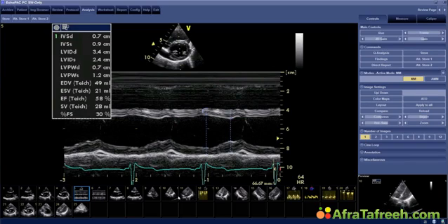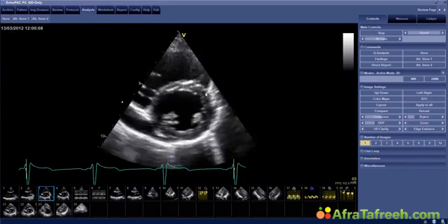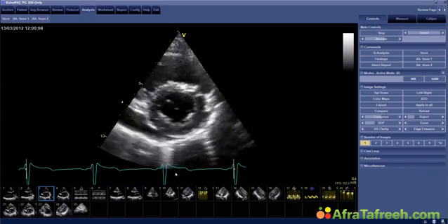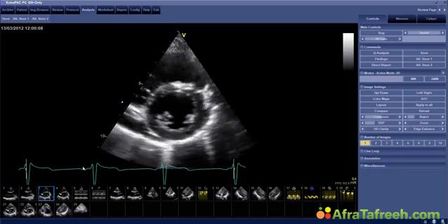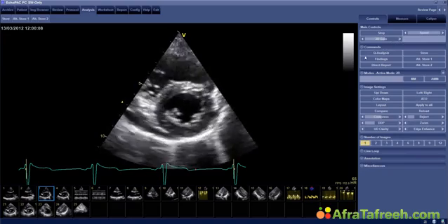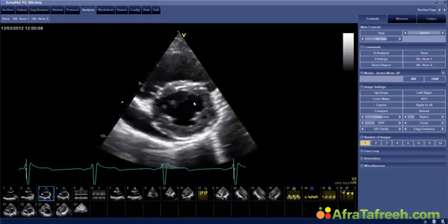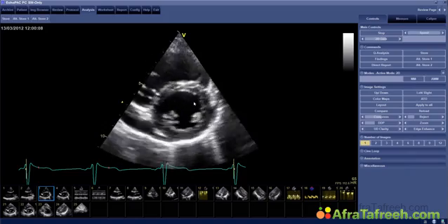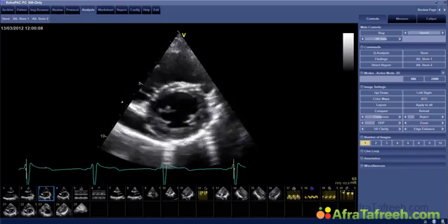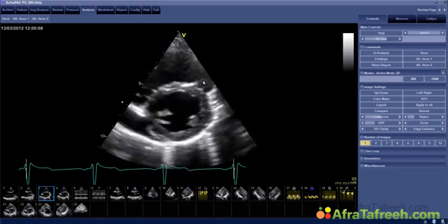Yes, two questions that I want to answer. First of all, Alan made a statement about septal motion, and I agree completely with him that the septal motion is not normal in this patient, because if you look at the motion of the left ventricle, you can see a rotating motion. And this is explained also because the patient has a broader QRS complex. This broader QRS complex leads to this abnormal septal motion, and in this case, you probably tend to underestimate true contractility. So in these patients, it's very difficult to really eyeball left ventricular function.